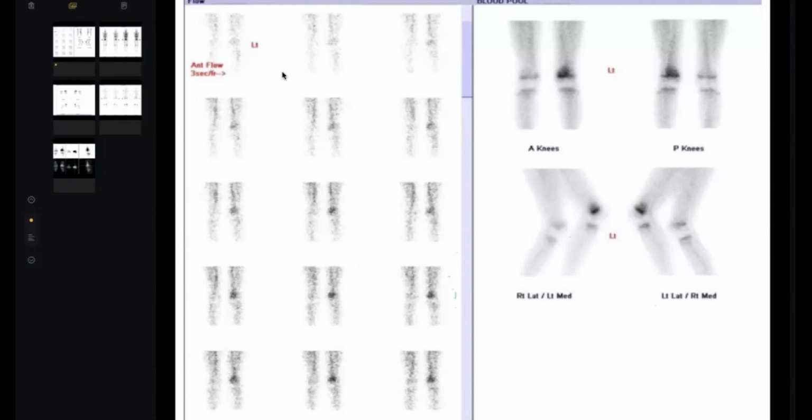Excellent. If this is chronic, what is the expected picture? And by the way, it is beyond the FRCR. But if this is chronic, would you see all this uptake, or would you see some photopenia here? No, I think because of the presence of sequestrum and dead bone, there will be cold spots instead of hot spots. Thank you, doctor, so much.